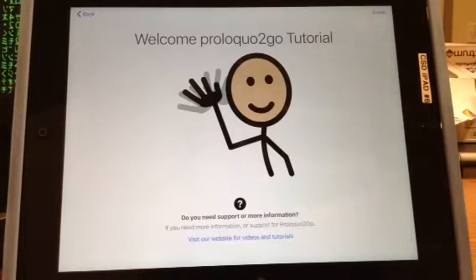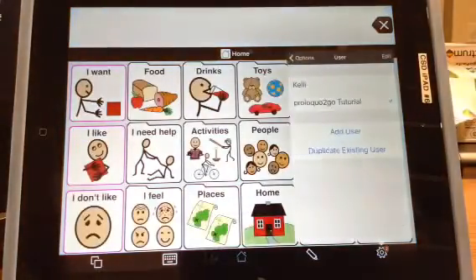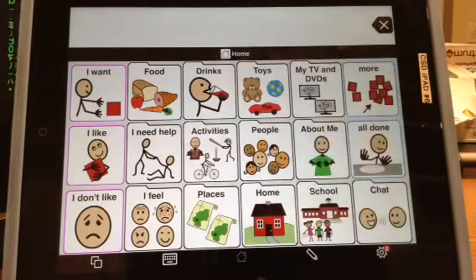and you'll eventually get to this screen here. It's just going to load up here, and if you want your screen to look like this one here, choose Crescendo Core Vocabulary followed by Basic Communication Vocabulary, and you will arrive at a 3x6 standard series of buttons, which is the template for Proloquo2Go's basic communication.